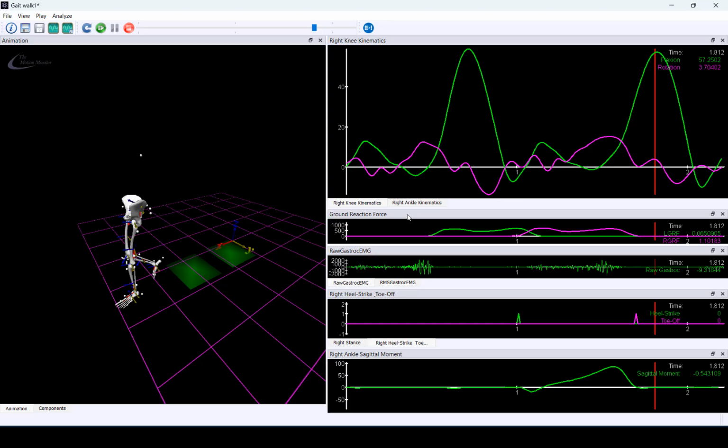As you become more comfortable with the MotionMonitor xGen, you can take advantage of our advanced functionalities, such as creating or customizing icons that control the window layout and which graphs are shown at a time. You may already have some of these icons defined in your data collection workspace.